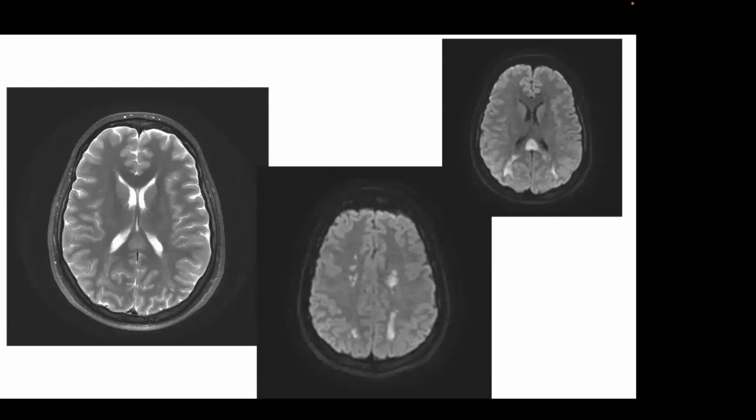It's a venous occlusion, yes. That would be an excellent thought. But she ended up having an MRA. This is what her MRA looks like. So again, she's 3 days postpartum. She has an abnormal MR scan with all of these vascular stenoses involving both sides.